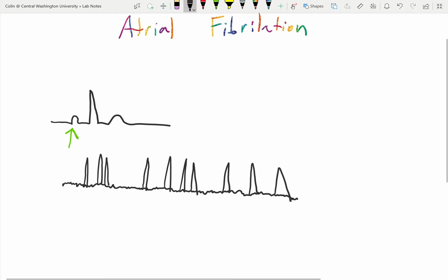And so your ventricular beats look like great triangles, right? Like these, I mean, forgive my drawing here, right? But these should all look the same. But you notice we don't see really any T waves, and we certainly don't see any P waves. It's all just scribbly noise and nonsense.